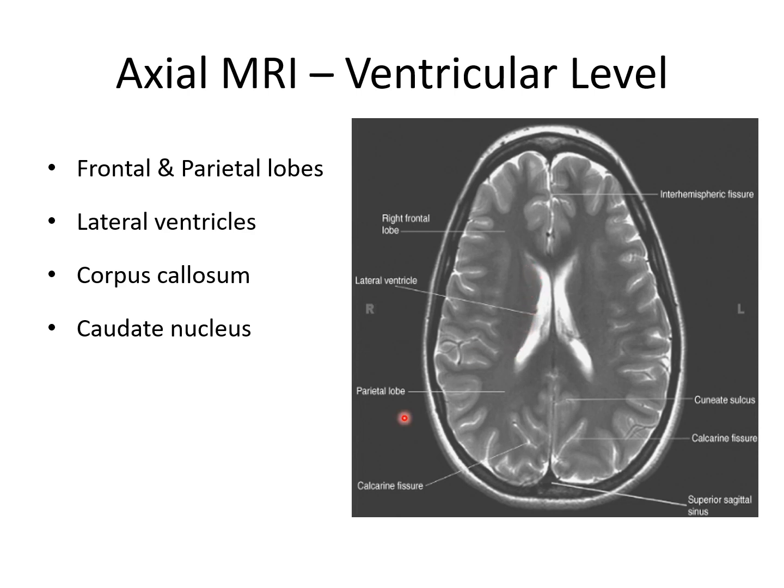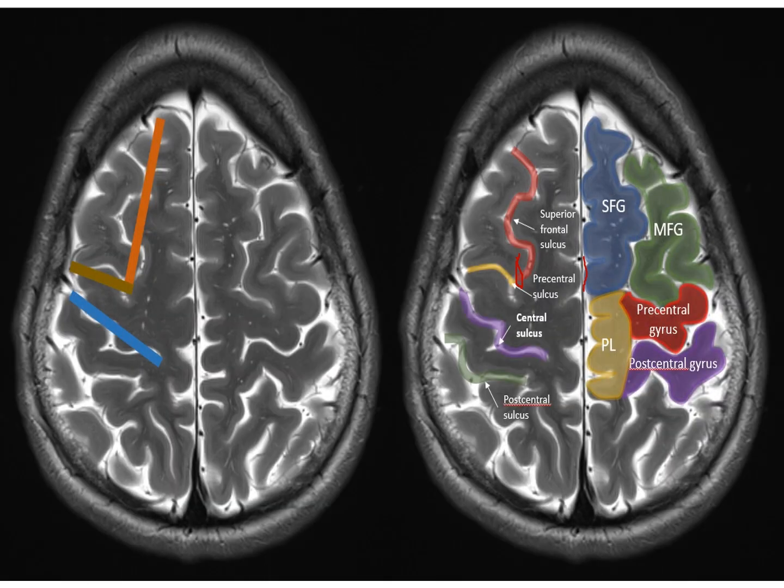whereas the caudate nucleus can be seen along the wall of the lateral ventricle. And just lateral to the lateral ventricle we can see this thin dark structure, which is the internal capsule. So this is the internal capsule, and just above the lateral ventricle we see the cortex of the brain.